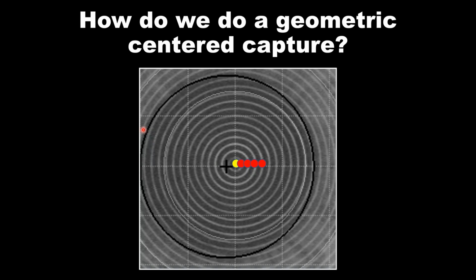So move as many rings as you need to. The angle alpha can be as low as something like 3 degrees to as high as, I believe, 12 degrees, if I remember correctly. So there's a wide range of angles that can exist in the population, meaning that it may be half a ring, it may be 4 rings, it may be more.